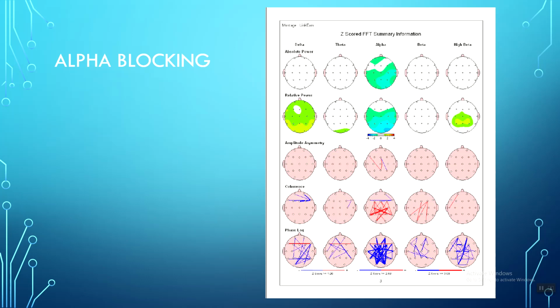So learning how to look at the raw EEG and determining what am I actually looking at, where's it coming from? That's beyond what we're getting into now, but it will really help when you look at these flat maps to know what you're looking at. Because someone could have 13 hertz alpha and the beta is going to show up here as bright red. But it's not beta, it's just fast alpha.